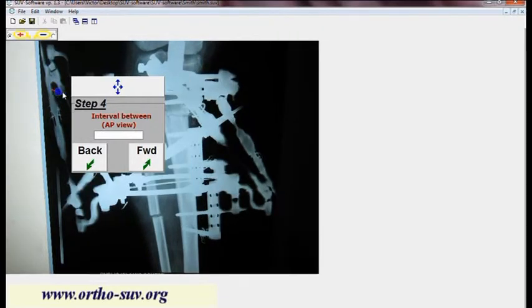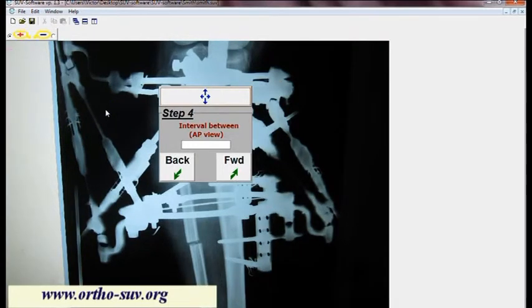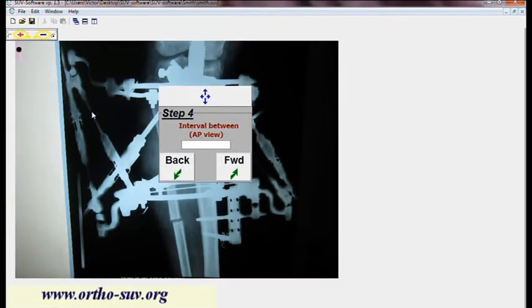You can do it twice or more, the necessary number of times. If you think that the image is too large, you can click another box, the minus box, and also click twice in the field of the X-ray, and it will become smaller.